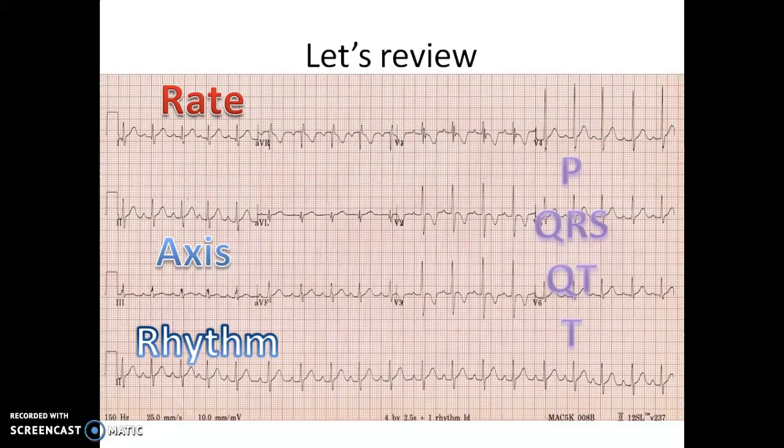So an upright T wave is because why? Good. So the upright T wave is because of what we talked about in the fetal circulation. The upright T wave is due to the extreme right axis, the repolarization is coming from the right side. Within the first few days, as the neonatal circulation takes over, T waves become inverted, and this remains like that up until about 8 to 10 years of age, and then it goes to the adult pattern.